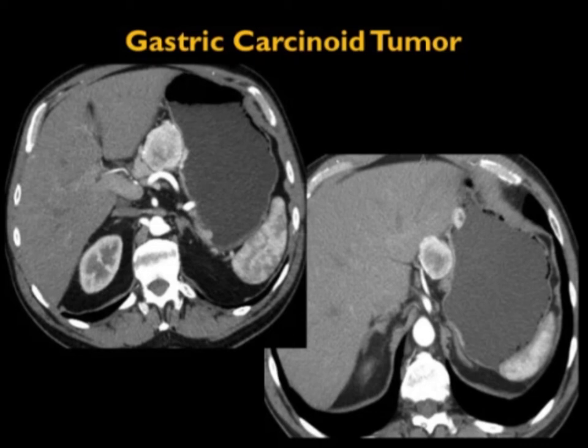Now, sometimes when you think about tumors, you also will think about other tumors. So, for example, in this case, you look quickly and you say, what am I looking at? First, I think there's a neuroendocrine tumor of the pancreas, but then you look and there's a mass in the stomach which is vascular. And these are simply enlarged nodes in the peripancreatic and celiac zone.